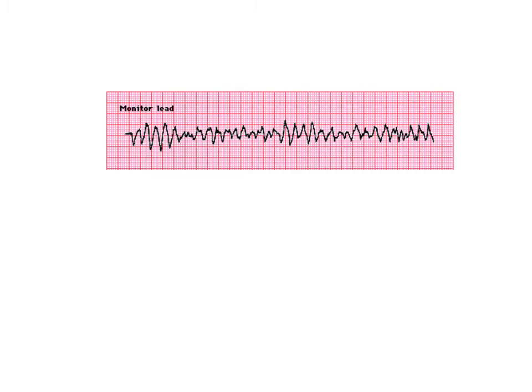VTAC. All right, what about this? You might want to shock it. So this is VFib. It's wide waves when you look at it, and it's very much not discernible. There's no wave I can really look at and go, okay, that looks just like the other one. It's really odd in terms of there's so much shape form going on in it. They're small and all over the place. So VFib.